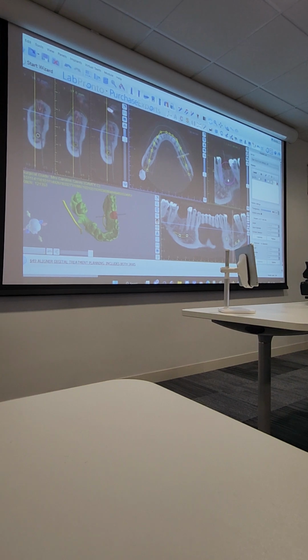Or I haven't got enough vertical thickness. I want to place my implant subgingival. I need 1 more millimeter for my tissue. Let's drop it down by 1 more. So you're in control of everything all the time. This is the time to think about all that.